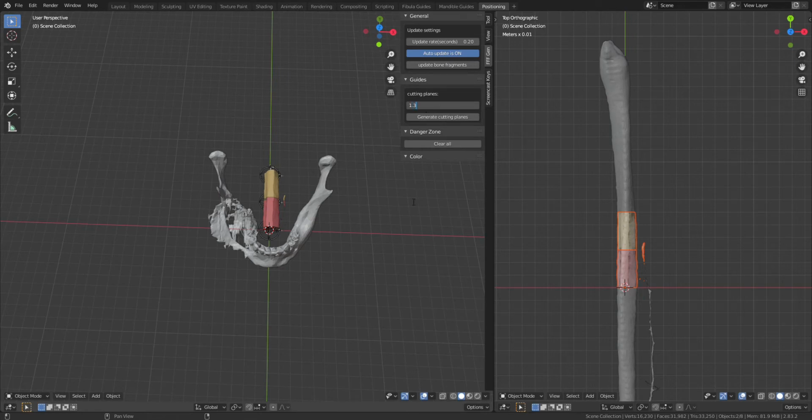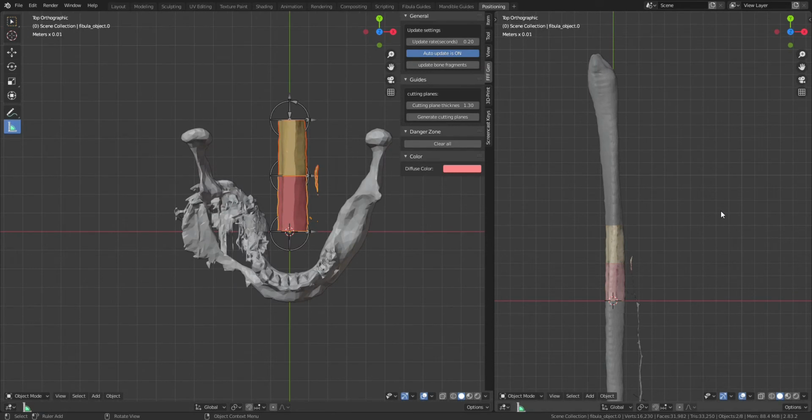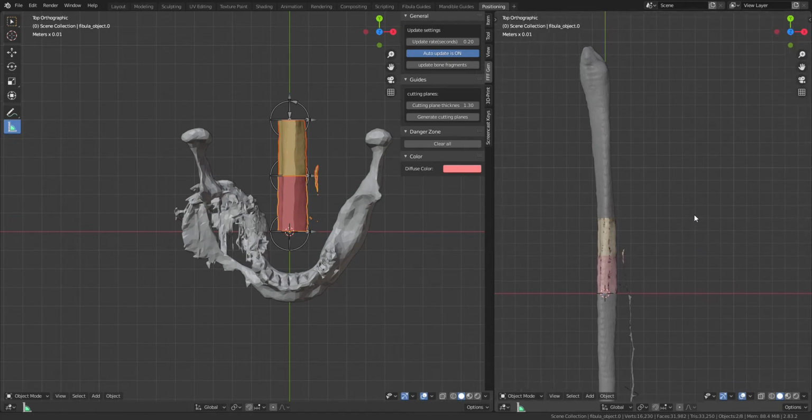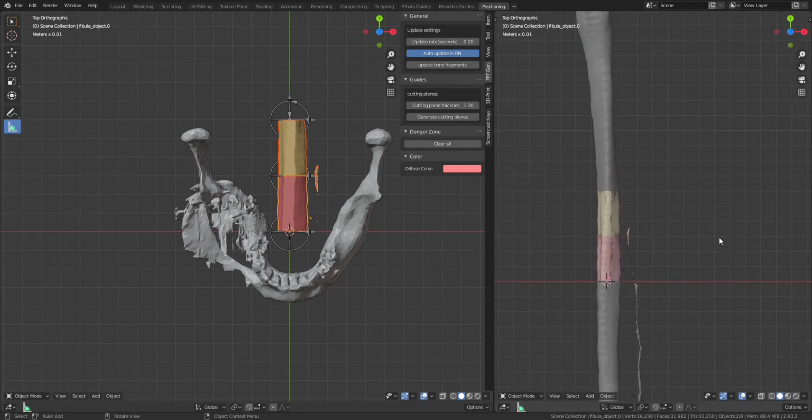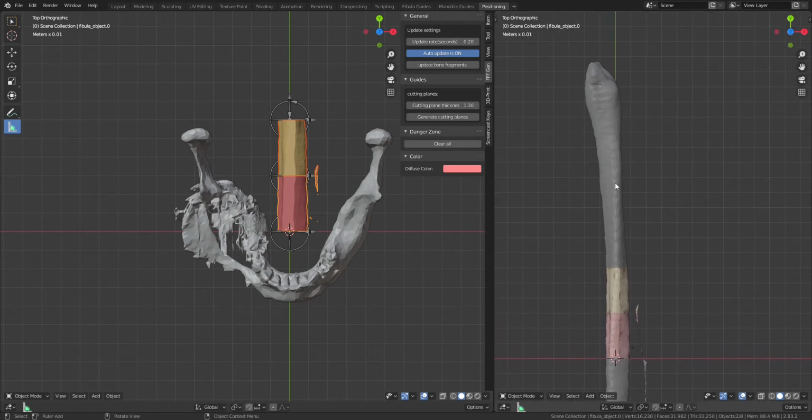Okay, like that. The CT angiography of the lower legs as well as the mandible was performed in another hospital, and I'm not satisfied with how the CT angiography turned out, because the perforating branches of the peroneal artery were not visible.